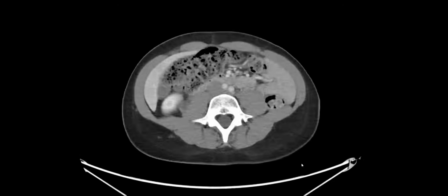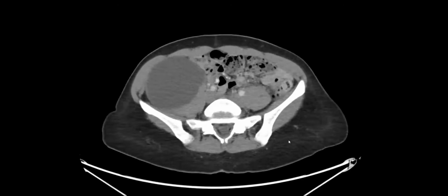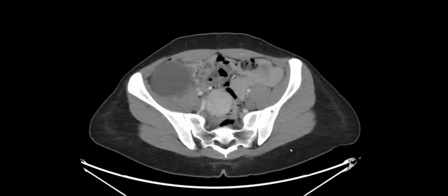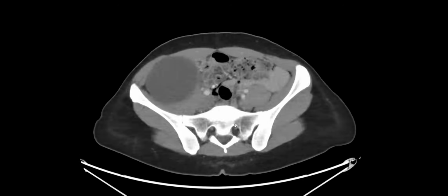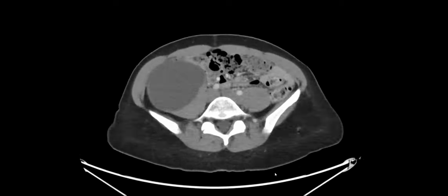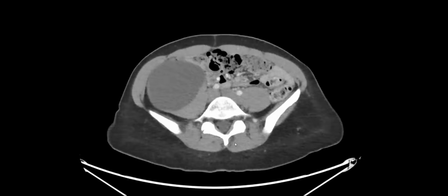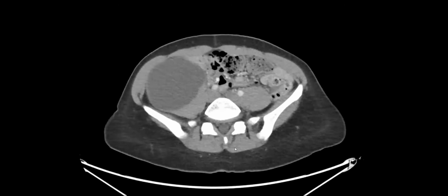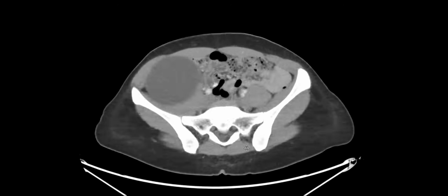Awesome. Okay. Not an eye test. We see a fibroid uterus and this cystic lesion. It looks like there's a claw sign from the psoas. Makes me almost think about a primary psoas process.